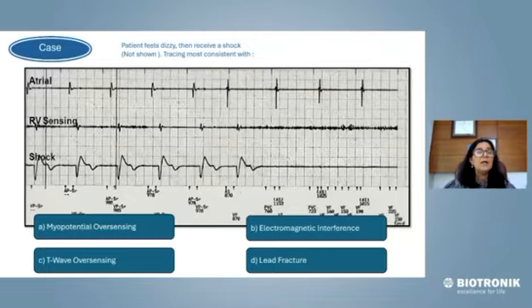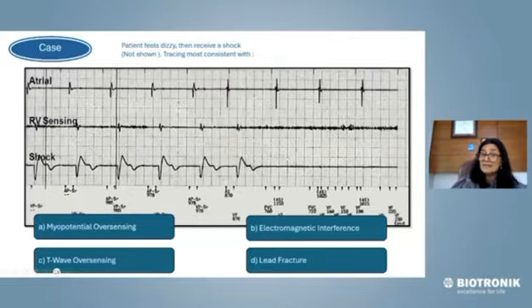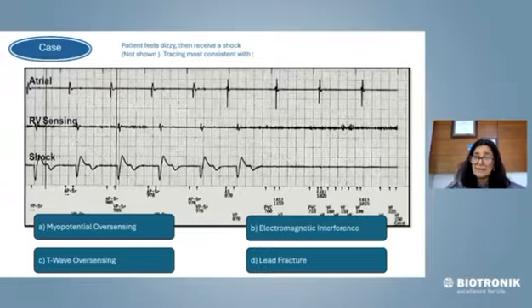Now, if you were to take each one of them, it's not a question of you answering it correct. It's a question of understanding them all. Clearly, I told you that if it is a T-wave oversensing, let's start with T-wave oversensing. For that, you look back. Is there any T-wave sensing here? No. Second, it should not have had an asystolic spell. There is a ventricular fibrillation which has been detected while nothing is happening in the RV electrogram. So it's not a T-wave oversensing.